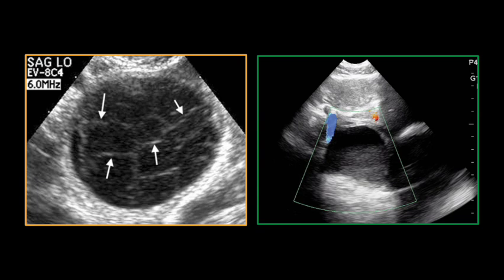Here are a couple of ways that hemorrhagic cysts can show some internal echogenicity. On the left, this is an example of a cyst that's interlaced with these bright connecting linear signs. It almost looks like a honeycomb or a stepping stone or like a pizza, I don't know, something over here, the cratered moon. But what this represents is a clot that's forming, and these bright septations are actually due to fibrin cross-linking up during the coagulation cascade.